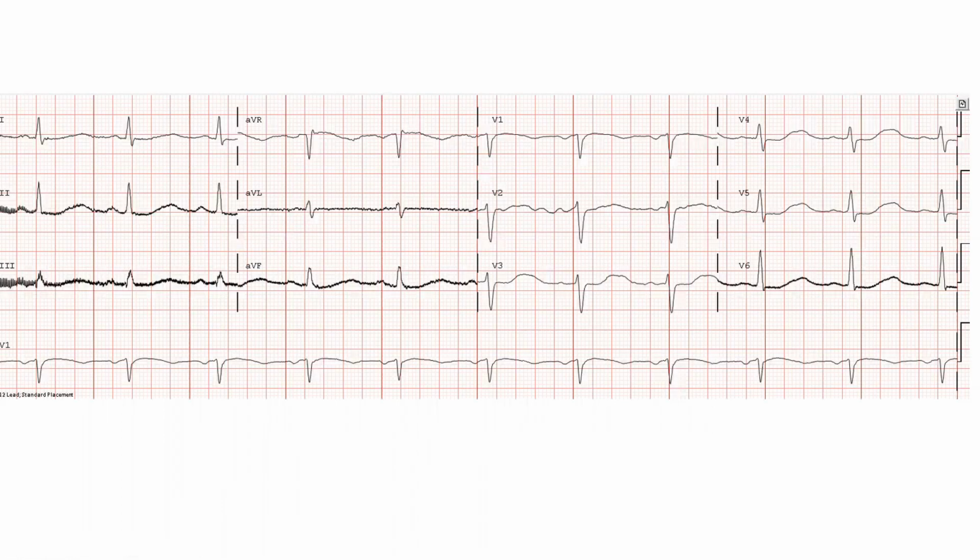There is another differential diagnosis even for that. So I mentioned diffuse ischemia, including left main ischemia. I mentioned secondary ischemia, very important depending on the context. There's another differential. This patient, what's the diagnosis on this EKG? So he has diffuse ST depression with ST elevation in AVR.